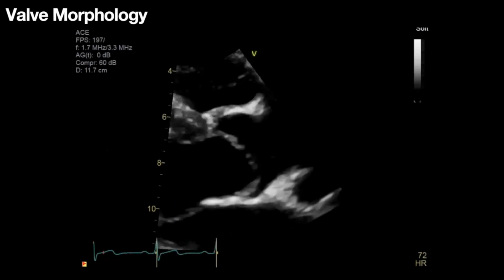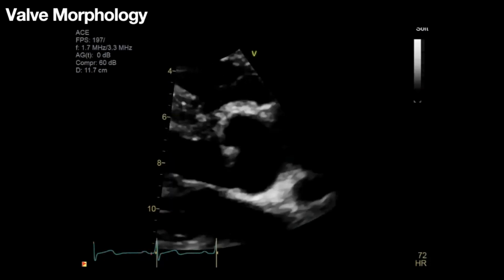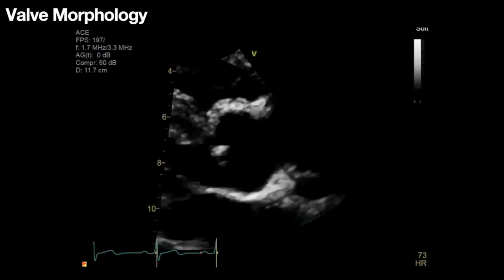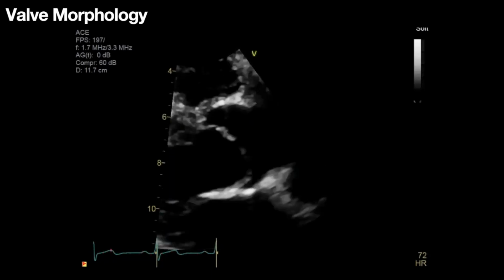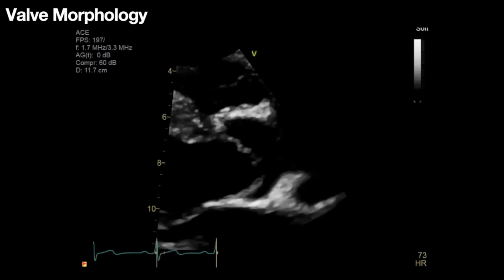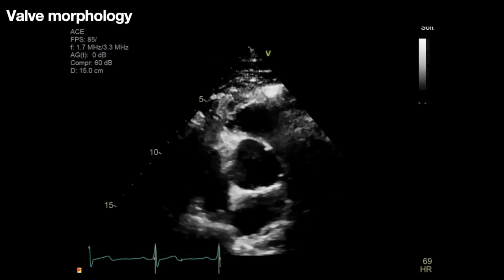You'd have to look around to see what company it keeps. This could be a bicuspid valve. This could be an off-axis normal valve, although I don't believe it to be, or this could be rheumatic involvement of the aortic valve as well. But on this one view, it'd be hard to make a diagnosis. That's exactly it. You hit it out of the park, Foti. So this is the same valve seen in parasternal short.